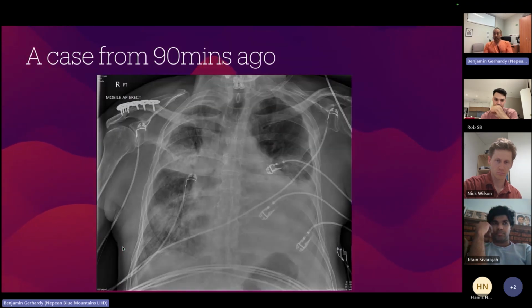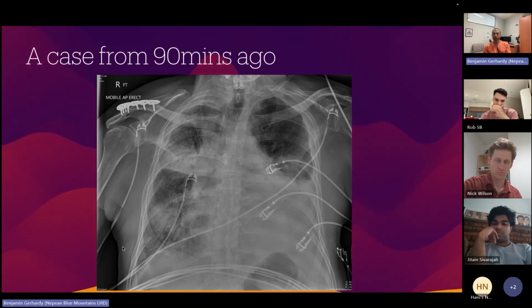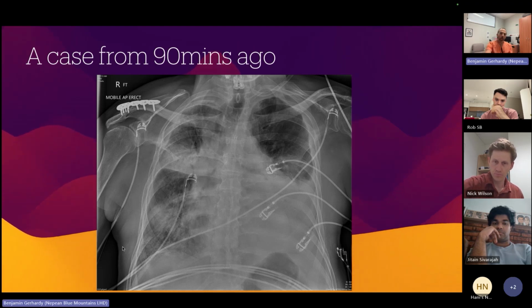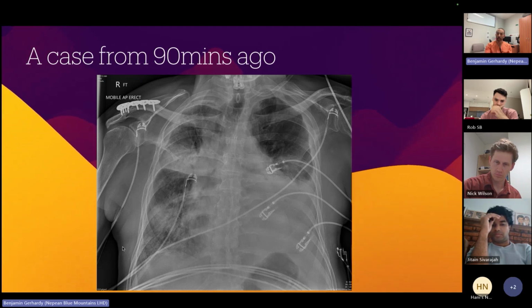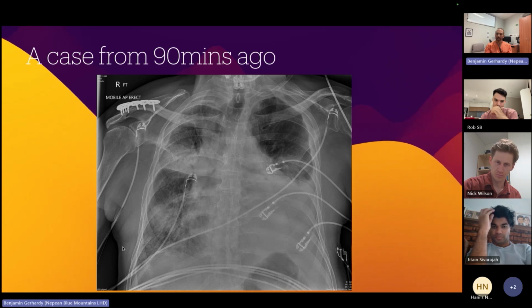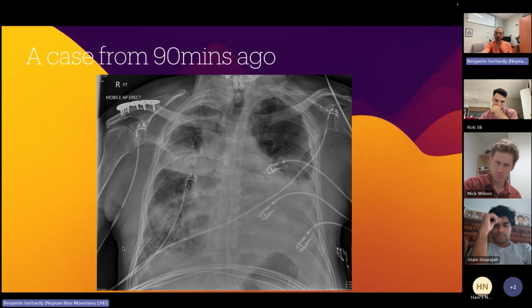And so this is his chest X-ray, and it looks pretty atrocious. What I couldn't pick from that X-ray was what's actually happening down that left base. He's got a systolic blood pressure in the 80s. He's got a lot of swing on his art line. Is that a large pericardial effusion, or is it a pleural effusion? And then in his right lung, obviously pretty bad.